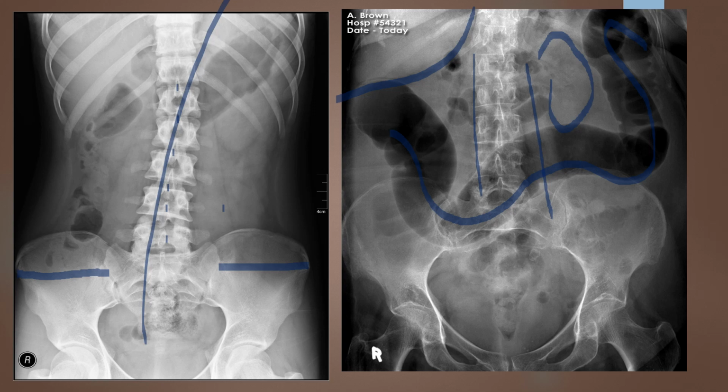We have trabecular pattern, but one thing I'm thinking on this patient is they do not have the same kind of bone density that the patient on the left has. And so that's why, again, it's looking a little bit more contrasty, but it's because of the patient as much as it is because of the image.